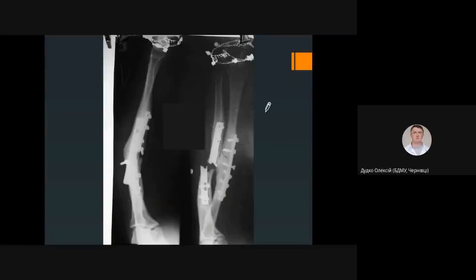Okay, that is another interesting X-ray. We will start again from determining the views. This would be an AP view, and that would be a lateral view. There are some rotations, they're not strict views, but what else can we see here?